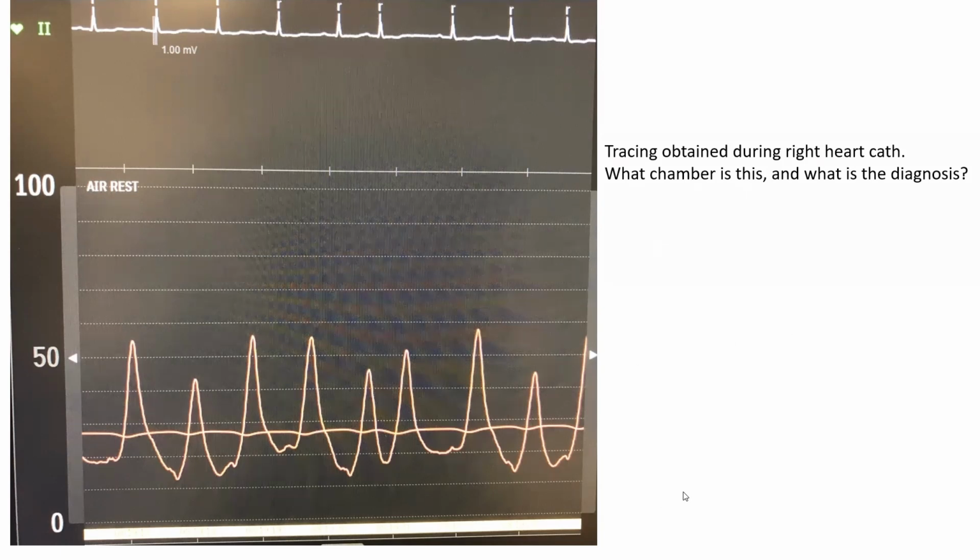The first thing, the easiest thing to look at, is the segment between peaks. This is even irrespective of the EKG. Segment between peaks. Is it mostly horizontal or upsloping? It is not arterial. The arterial pressure is downsloping throughout diastole with a dicrotic notch typically. You have a horizontal or upsloping segment like here, or a clearly horizontal segment here during a long RR interval. This is not arterial.